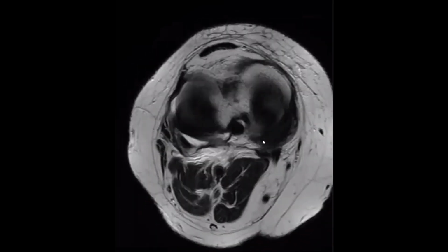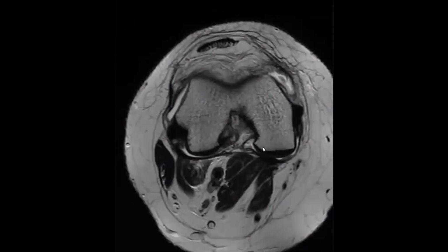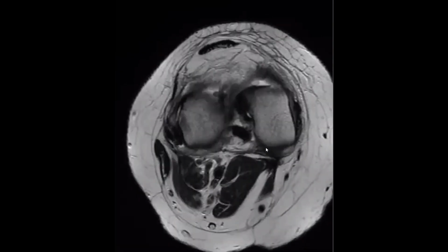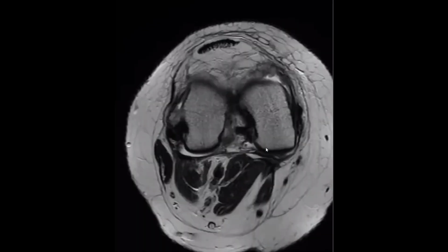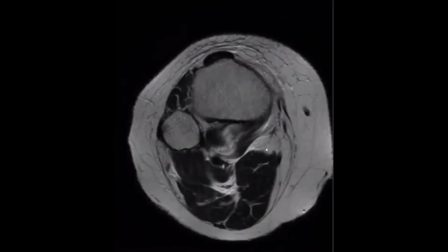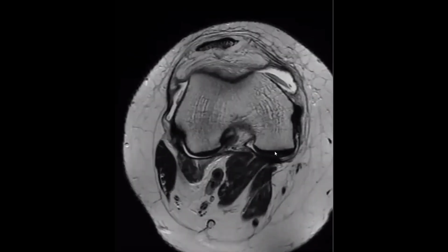Sir, I will scroll down to confirm which one is medial and which one is lateral. Is this one the medial or lateral? Sir, where the bulk is more, that's medial, or we can see from the fibula. So I think this is lateral, and the other one is medial. I'll confirm this while scrolling down. Yes, this is lateral, and the side where the bulk is more is the medial.